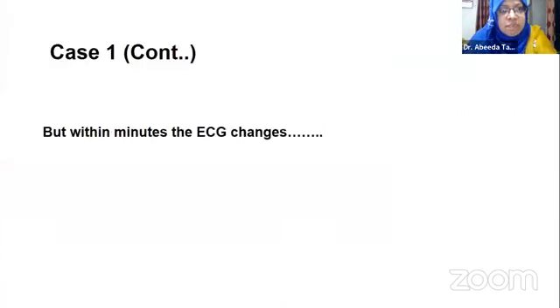So can you please unmute yourself again and say what is the ECG change from the first one? Naim, would you comment about it? Yes, sir.